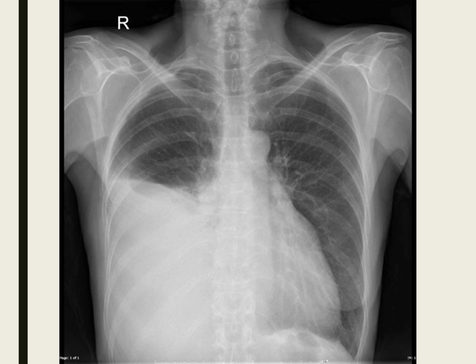Is there any volume loss in terms of the right lung? Probably not, actually, right? So volume loss would lead to what? Shift, right? Significant volume loss if there was an obstructed thing. But you can see that the mediastinum is not pulled this way very hard, so the effusion is just laying out, and I don't think it's causing any volume loss. I mean, probably the lung is not atelectatic per se, but it's not completely obstructed. So it's a simple effusion, you know, kind of large.